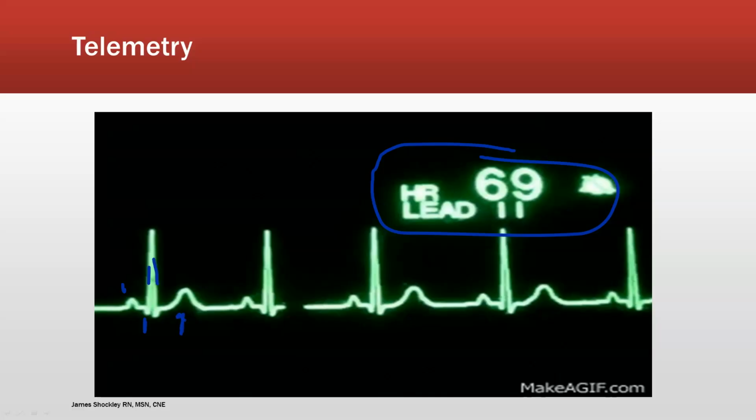What don't I see? I don't see any of those big boxes or little boxes that we're always talking about, and that's fine. Totally fine, because when you go to print out a strip, they'll probably print on there for you, or again, like I said in our previous videos, most machines now will have electronic calipers that will actually do the measurements for you.